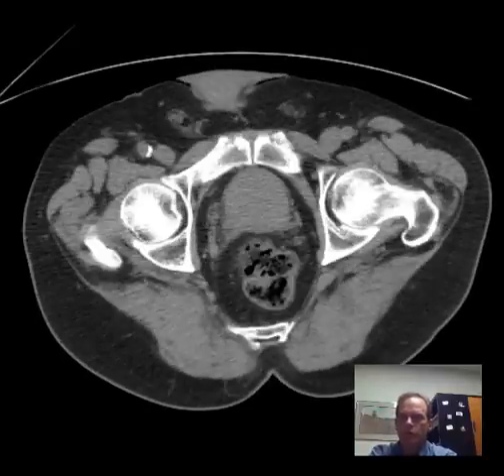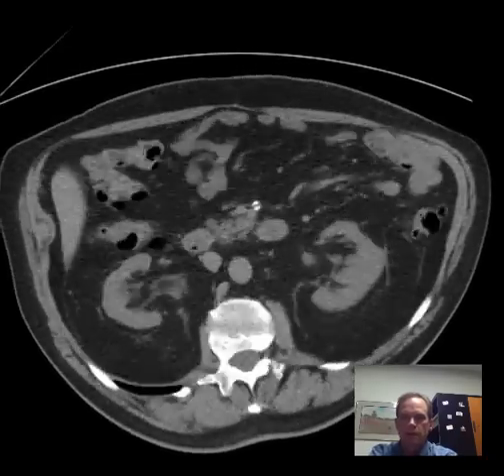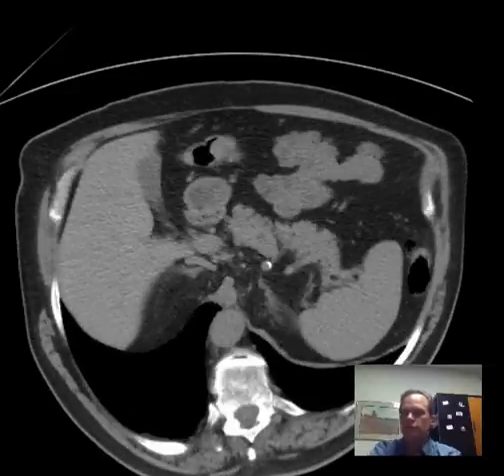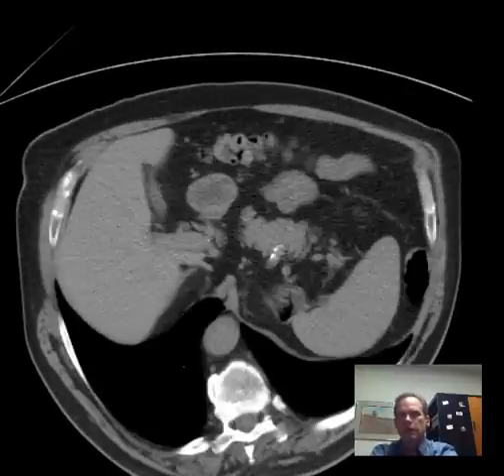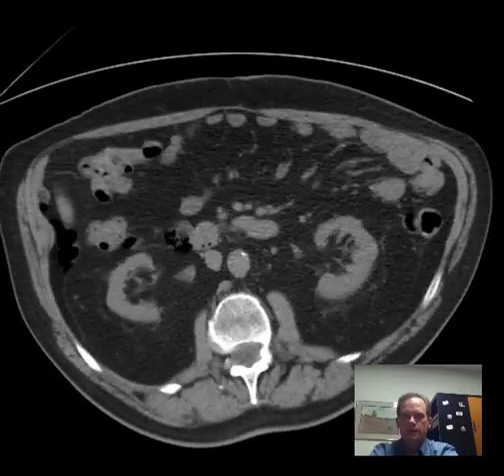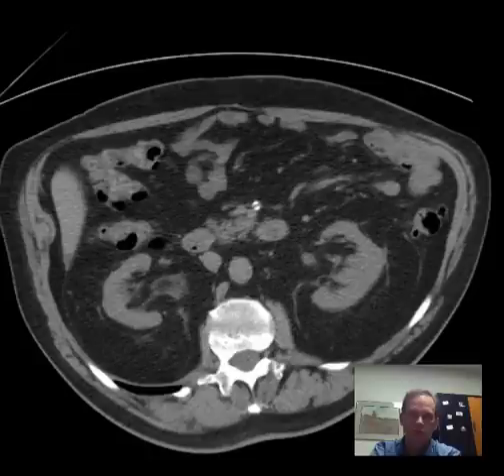This is a patient who had pelvic pain, a male, and I'll give you a chance to look over the case a little bit here. This is an example of a patient that's scanned using a protocol we call CT renal colic or CT urogram. The patient is lying on their belly, also known as prone, and that's kind of helpful sometimes because they can have distal ureteral stones. We see distal ureteral stones quite often, and let's see if we can follow these ureters.